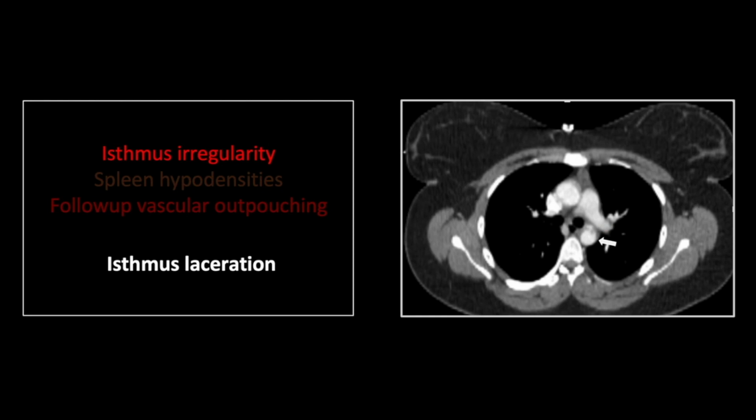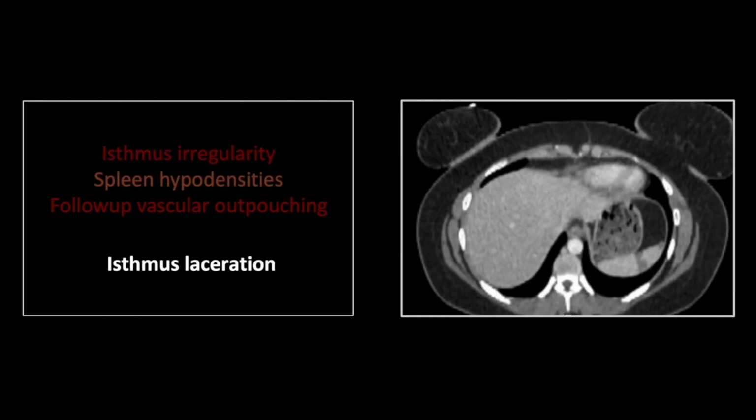Note the relative lack of periaortic or mediastinal density, which can be an important indicator of large vessel injury, but which is not universally present, and which, of course, will not be confused with this anterior triangular lobulated density, which I'm sure we all recognize as normal thymus.